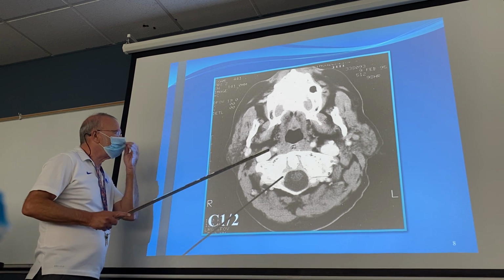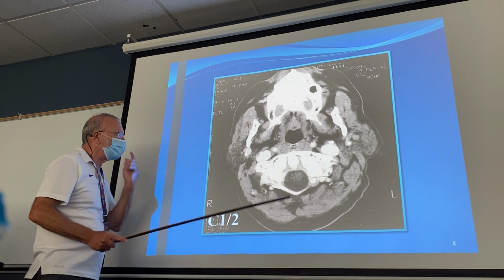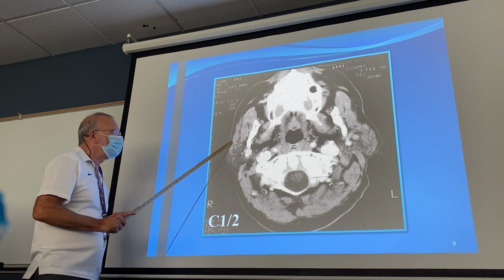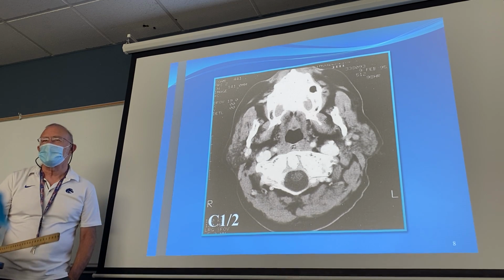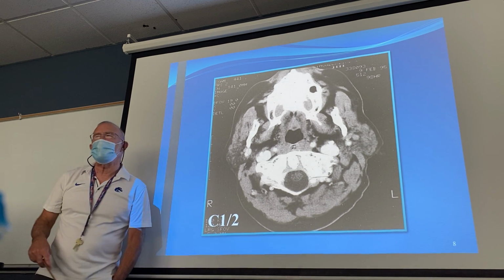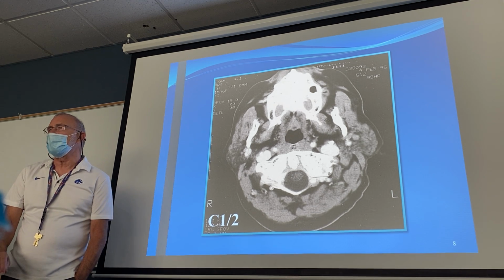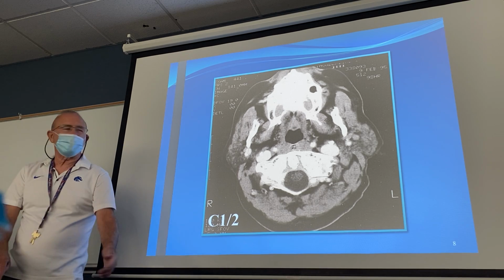From the standpoint of other landmarks, you're picking up the nasopharynx over here. You're getting just below C1. Once again, you have internal jugular vein, internal carotid artery, mixed attenuation seen bilaterally, which is again the parotid gland, and just transitioning in, either term will be acceptable. If you want to be correct, it's called the retromandibular vein, but as we work our way down, it will transition into external jugular vein.